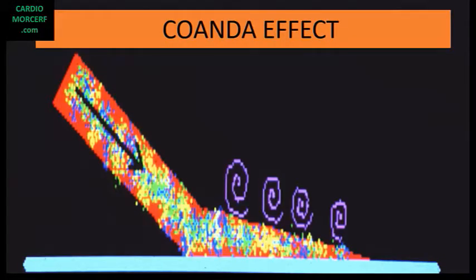The Coanda effect occurs due to a series of factors. Whenever a jet encounters a wall or a leaflet at a certain angle, it may get stuck to it. Because the jet has high velocity and hence low pressure, it makes the blood cells be pulled into the jet, since the pressure inside the left atrium is higher than in the jet. These cells increase the jet mass.